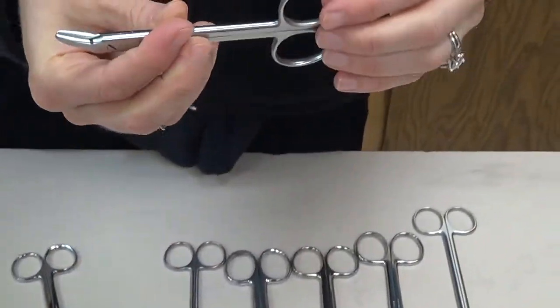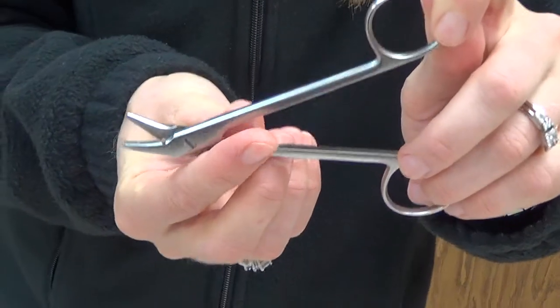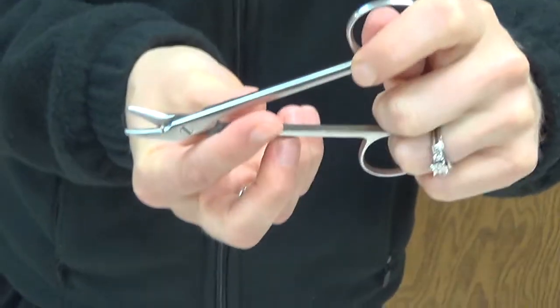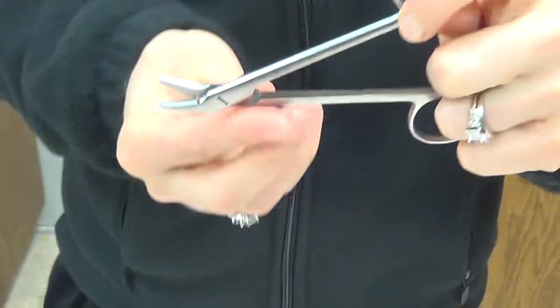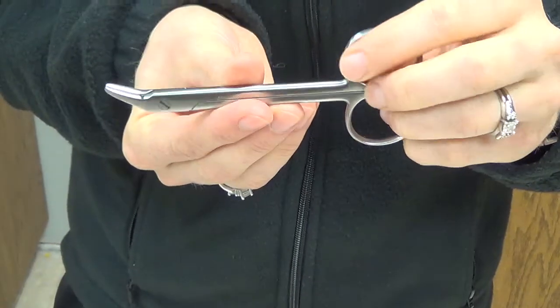Another scissor that we have is called a wire scissor, which by its name, of course, is utilized to cut surgical wire. Sometimes we use wire to fixate fractures or all different reasons that we could utilize that during the case. And once we have the length that we need, then we need to cut that wire. And if we used any of the other scissors, we would damage that. So we need to use this specialized scissor to cut any wire that might be utilized during the surgical procedure.